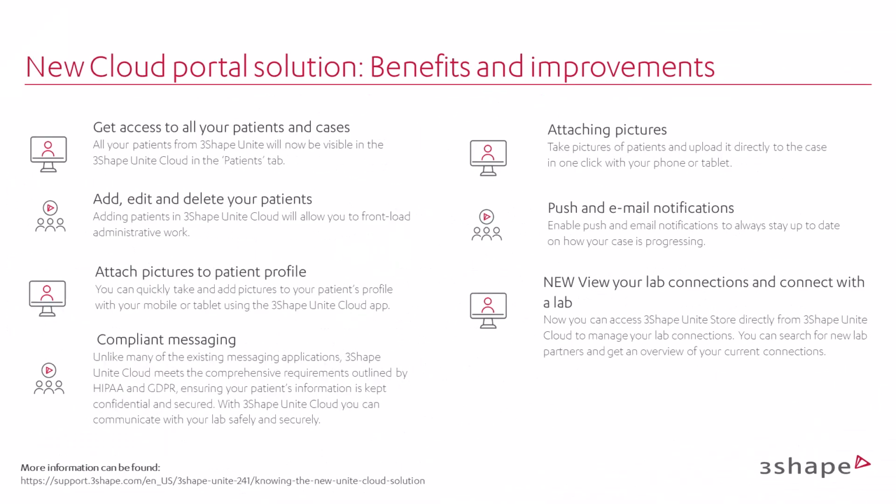The new cloud portal solution brings several benefits and improvements. Access to patients and cases: all your patients and cases are now visible in the 3Shape Unite Cloud in the Patients tab. This provides centralized access to patient information. Patient management: you can add and delete patients directly within the 3Shape Unite Cloud, streamlining administrative tasks.